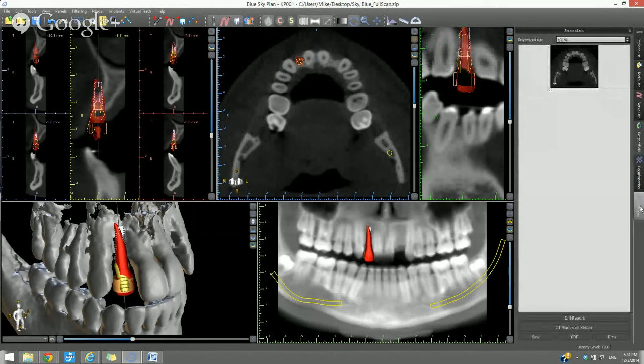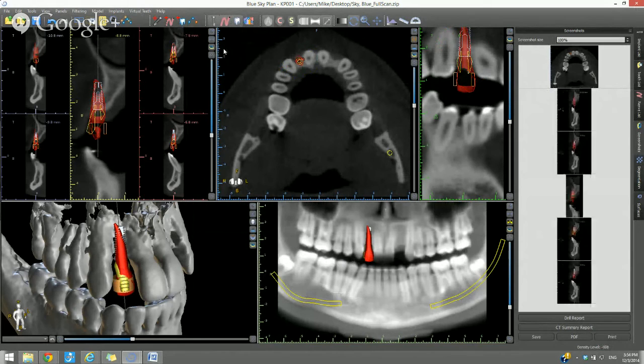What happens is it opens up our screenshot basket. So we could put in different screenshots from different views, and it puts them in. If we don't like a particular image, we could remove it. If we do like it and want to save just that image, we could save it. If we want to remove all, we could remove all, or we could send it to the clipboard to use in other pieces of software. We can also change the order of the different images.